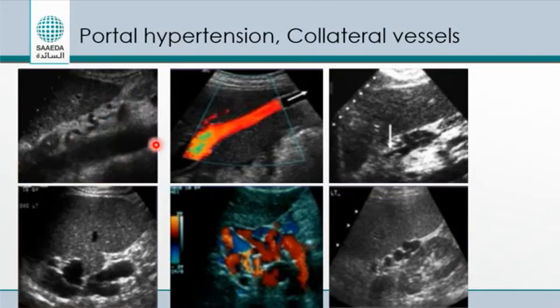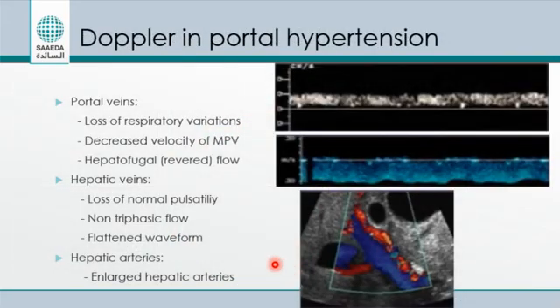This is the aorta, and this is the gastroesophageal junction, and you can see these collaterals here, they are gastroesophageal collaterals. You can see here the falciform, the umbilical vein recanalization going to the umbilicus, and you can see here this is the spleen, and at the splenic hilum, all of these collaterals you don't normally see. Okay, again another case of splenic collaterals. These are possibly gastrosplenic or splenorenal collaterals. Again here between the spleen and the kidney, you can see all these flow voids are present, collaterals due to portal hypertension.